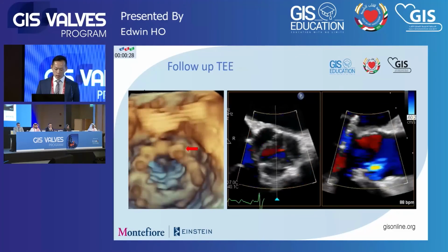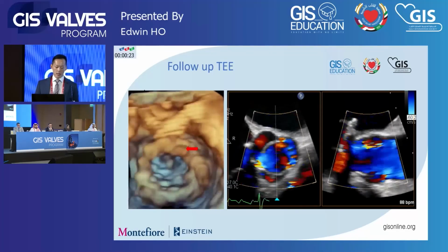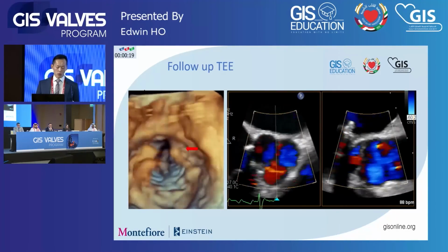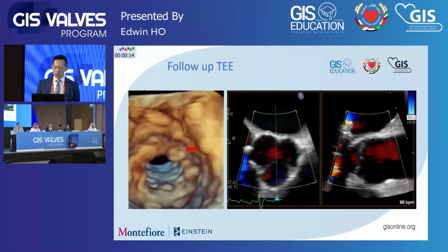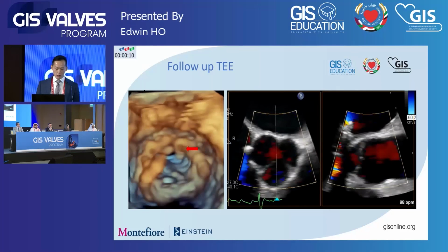And then this patient actually came back for an infection at a later date and had a TEE. This was to rule out endocarditis. But again, the nice thing about this study is we're able to confirm again that we still have that anterior opening from that slit and still no LVOT obstruction that you can appreciate on these aortic valve views.